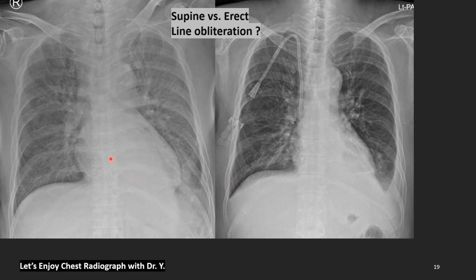This is AP supine view, so gravity direction is anterior to posterior, so that is not like these erect images. Pleural effusions are not here, but scattered, spread diffusely on the posterior side, more clear on the left diaphragmatic side than the erect view.